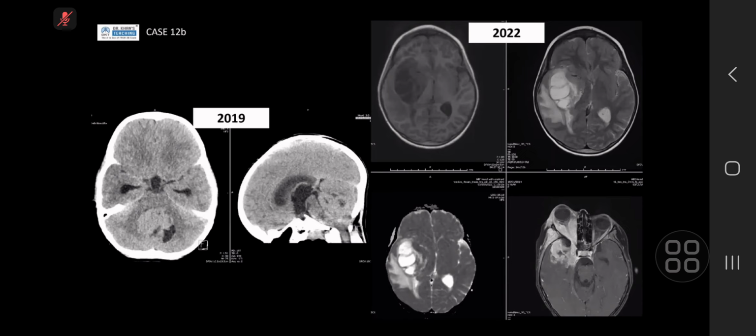Do you think that the lesion in the brain looks aggressive? How does that link to the lesion in the bone? If it were an adult, what would you be thinking? Is it a lymphoma? So the parietal bone lesion appears... If it had been an adult, I would have seen the temporoparietal lesion. I would have said it to be a glioblastoma.